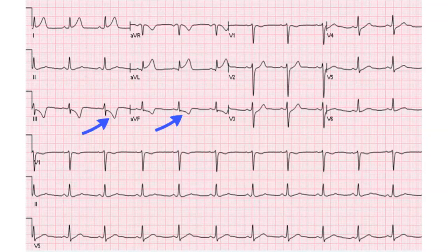It's not. In fact, ST depression in inferior leads is rarely due to inferior ischemia. It's usually reciprocal change. So if you see it, look very carefully elsewhere in the ECG. Look at the anterior leads and look at the high lateral leads to see if there's ST elevation, because then it's a STEMI. And if you look at lead AVL, you will see an obvious abnormality. There's a massive T wave. It's higher than the R wave. It's really peaked. And there's ST elevation, which is easily missed, but it's clearly diagnostic of a high lateral STEMI.